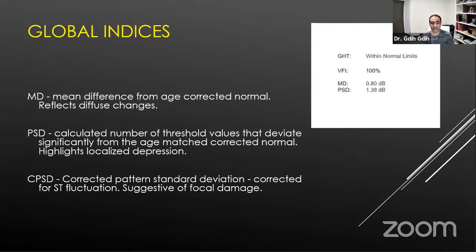Corrected pattern standard deviation is the same as PSD, but sometimes we have to correct for pattern standard deviation to confuse you more. As the glaucoma progresses more, sometimes the PSD improves, and you may wonder why. By the way, this is a Royal College exam. They love this. You have advanced glaucoma, but pattern standard deviation is becoming better now.